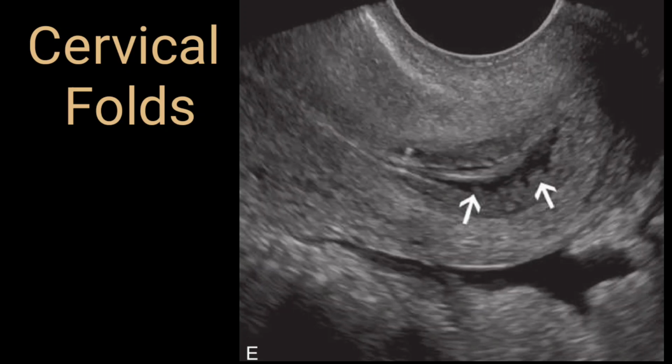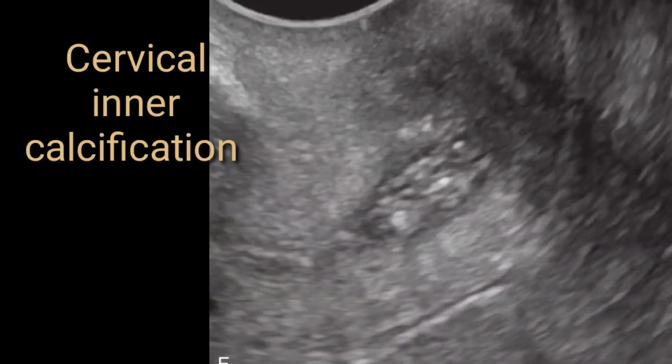This is quite normal. So if you come across any such type of a feature, you should not confuse, just straight away mention that these are cervical folds, and in the conclusion you can mention that these are called plica palmata, and there is no pathological process in the cervical region. Cervical calcifications are also very common. Again, these are insignificant. There is no such pathological process.